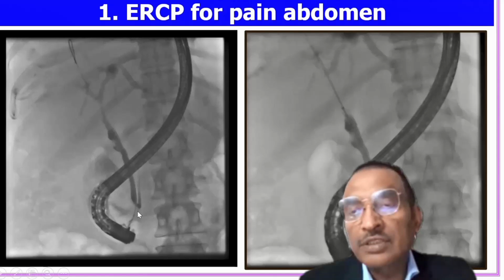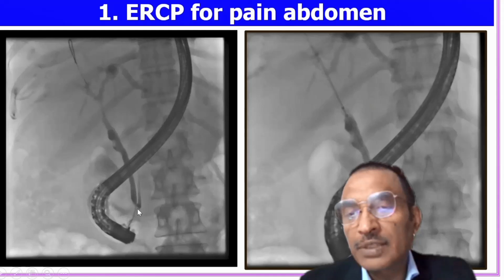It looks normal, and here you see carefully there is the pancreatic duct going. There are two types of configuration described. If you don't remember, no problem: B on P and P on B. So which is the dominant duct, and then it is joining. Different people have taken different criteria. Most commonly, 11 or 12 millimeters or more is taken as a long common channel.